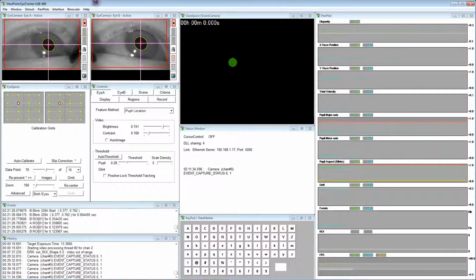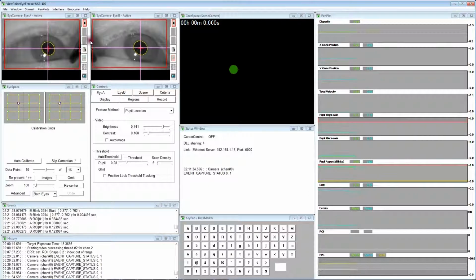The EyeCamera window displays overlay graphics that provide information about image segmentation and performance. The overlay graphics include thresholding results, which are the green dots indicating dark areas, and can be displayed by selecting the Toggle Show Threshold Dots button. The pupil location and diameter calculation results are the yellow oval fit to the pupil, and the corneal reflection location results.